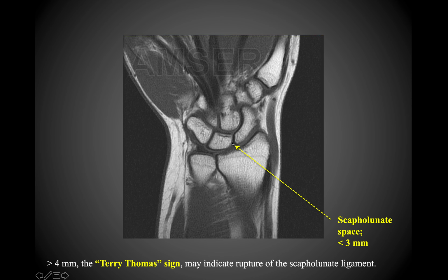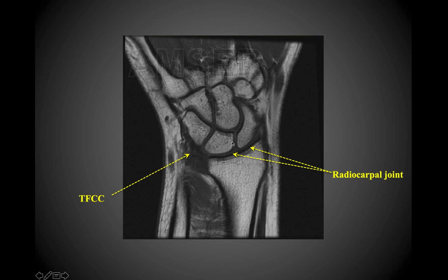He's a famous comedian who had a gap in between his front two teeth. So for younger radiologists now, oftentimes they refer to this as the David Letterman sign, because again, he's got the gap between his front two teeth. And so again, when that scapholunate space widens, that's going to be what indicates a likely rupture of the scapholunate ligament, which again is not present in that patient.